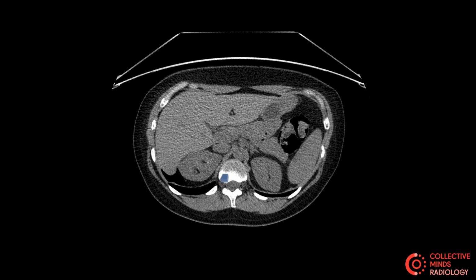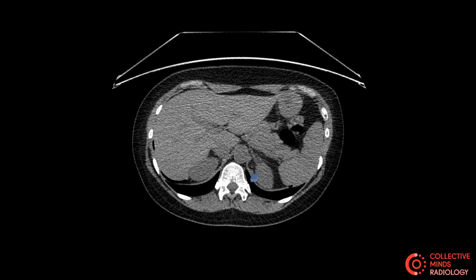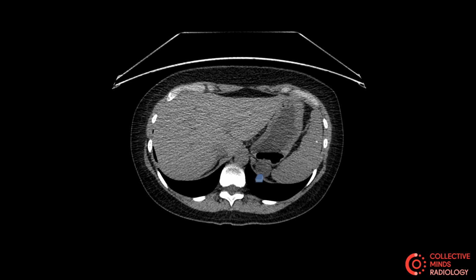Now, what's the other thing that could be causing abdominal pain? It's the pancreas, right? Pancreatitis. So the pancreas is a sort of fluffy, leaf-like structure sitting within the upper abdomen, and that actually looks completely normal. And again, all that fat around it looks completely black. It doesn't look like there's any abnormalities there. Okay, so the pancreas looks normal.